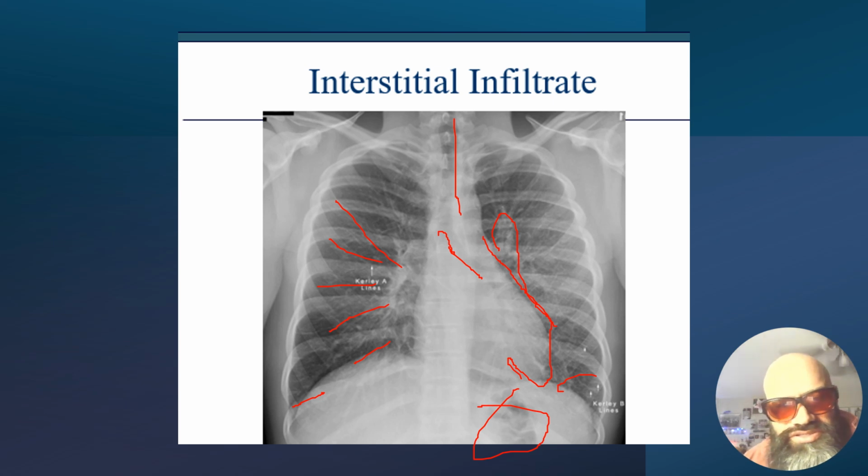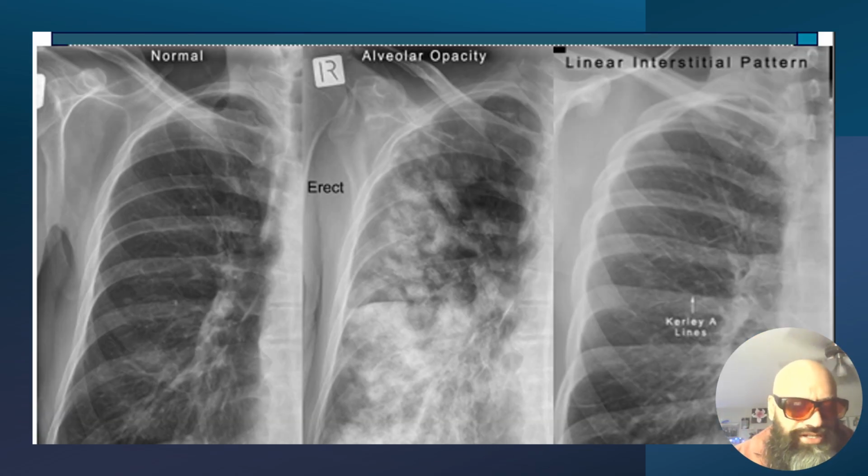These are called interstitial infiltrates. I notice a difference in appearance compared to alveolar infiltrates that have more of a round shape and a fluffy appearance. These are more like streaks, and they can mimic pulmonary vasculature as well. But these are areas that once had air and were invisible on a chest X-ray, but now have fluid and are visible, due to the pathologic state as presented here.